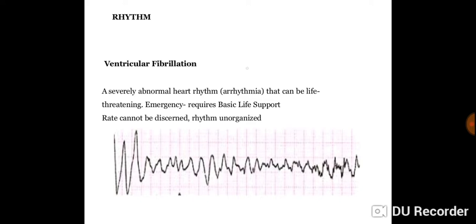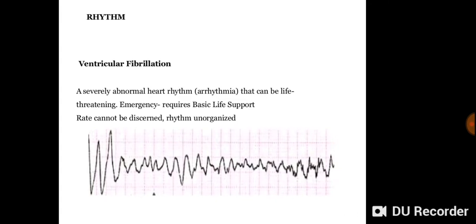The direction of current in the ventricle is haphazard. So you get this kind of ECG in which you only see QRS complexes that are not well formed and weird, and does not have a P wave or a T wave or anything else. So everything is weird, and you need to take this patient to cardiac emergency as soon as possible.